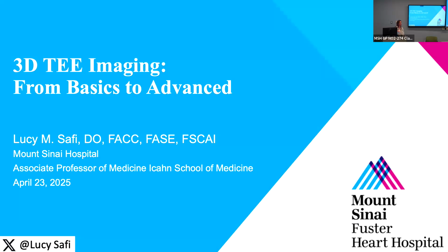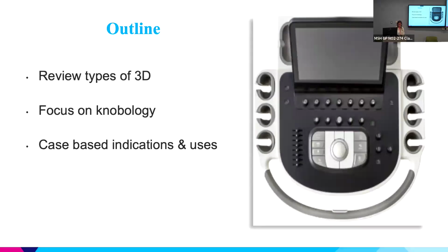I'm going to start pretty basic with just ultrasound physics and then move into some more advanced 3D stuff. We'll talk about the types of 3Ds. We're going to focus a lot on how-to, because that's the question I always get. You'll see during my talk, I'll have images, and not just images of pretty 3Ds, but I'll show you how to get them, because I feel like that is what you guys need to learn. And then we'll talk about some case-based indications and why you would get these images.